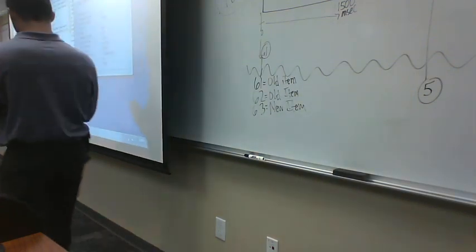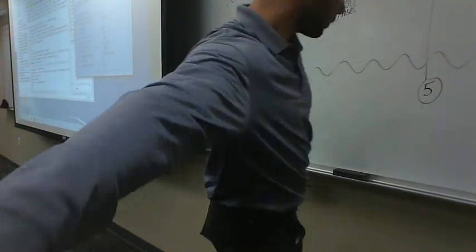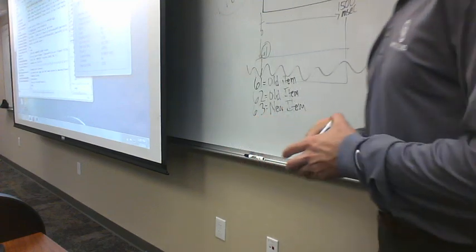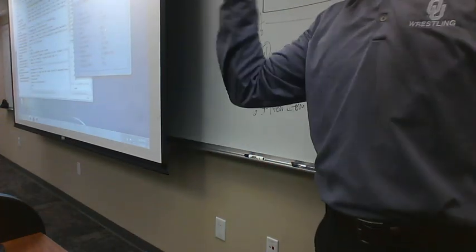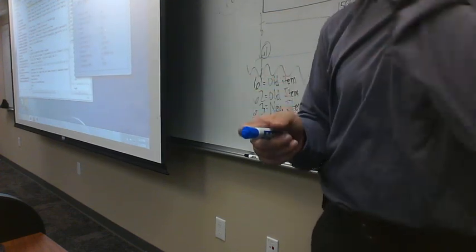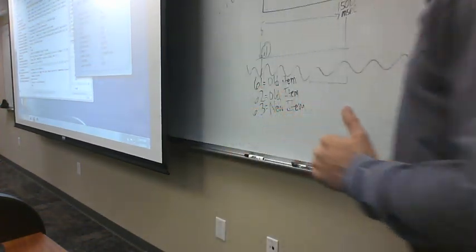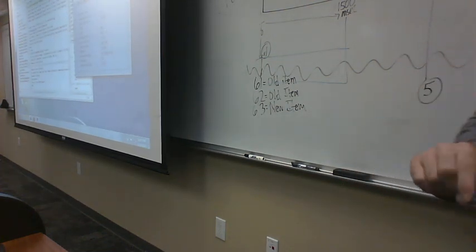So what we want to do is we only care about these 1500 milliseconds of EEG. Because when they're giving their motor responses, we don't want their motor cortex activity of their fingers pressing buttons. We don't want them yawning, stretching their head, moving around, going, oh, geez, yeah, I don't remember that, blah, blah, blah. We only want the clean brain data from here. Okay? So what we need to do is we're going to delete this and this.